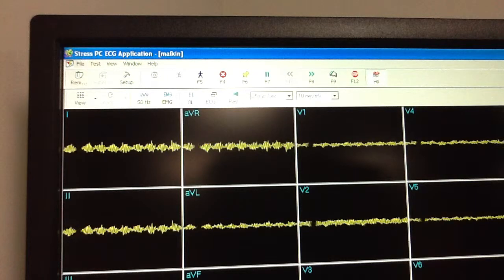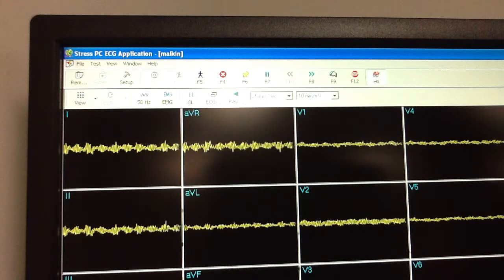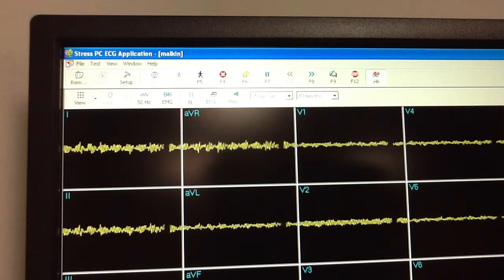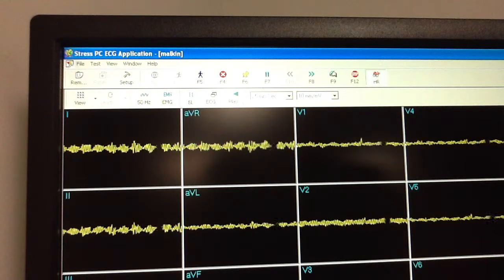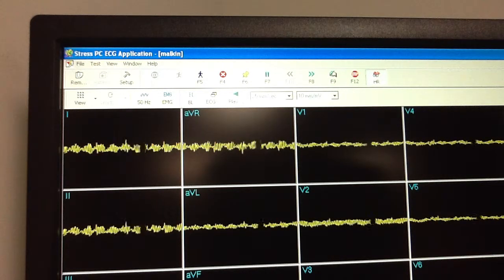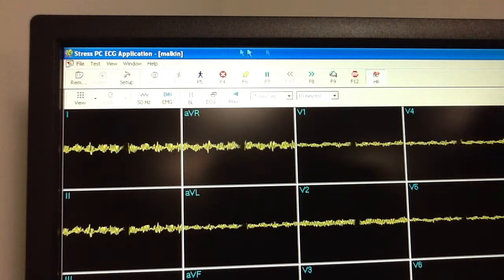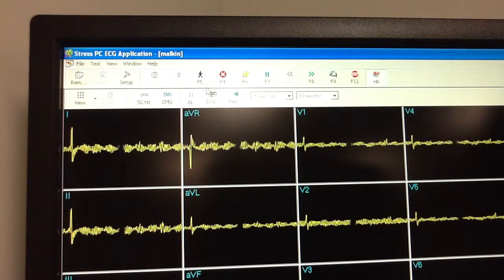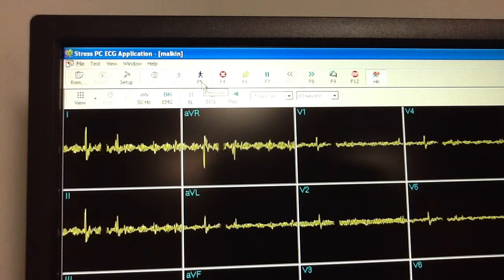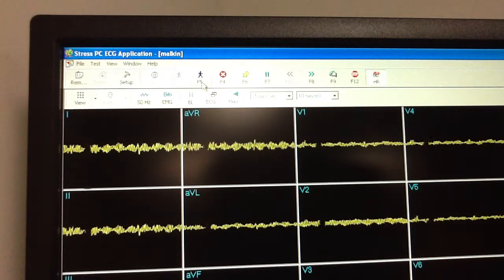So right now, you can see F2 and F3 are no longer highlighted, and then all of a sudden F5 and F4, F7, F6, 9, and 12 have all appeared now and have been made available. So the F5 button with our little blue man who's now walking is going to be our recovery button. Okay, so that starts a recovery phase during an exercise test.